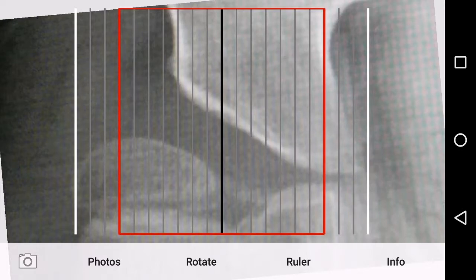Now, notice the edge of the acetabulum is inside the red box. If the lateral edge of the acetabulum is within the red box, the migration percentage must be 30% or greater, and a referral to a pediatric orthopedic surgery specialty center for continued hip surveillance management is indicated. Let's go to the right hip now. We'll repeat the same steps on the right half of the ruler.